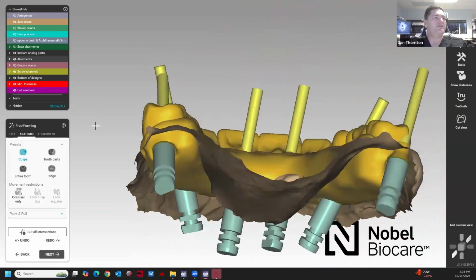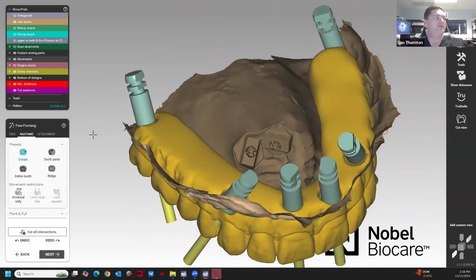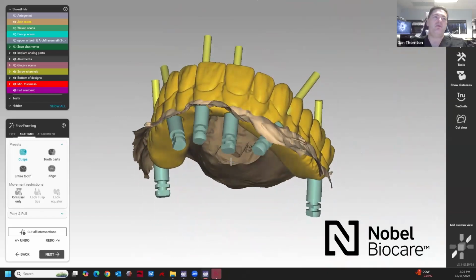All right, now that we have those in there, and it did a pre-calculation of where those implants are going to be, I want to show you guys a cool trick. Let's say the office sends you the iCam, which has its own scan flags, and they sent you the photogrammetry and the STL of those scan flags from the iCam system, and it's just floating there. You can align it with your tissue and have everything line up.